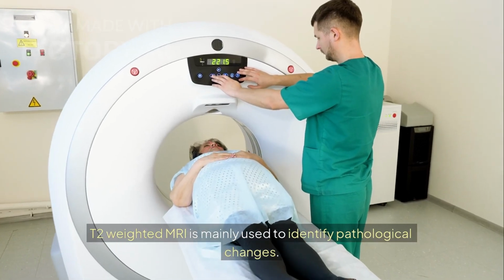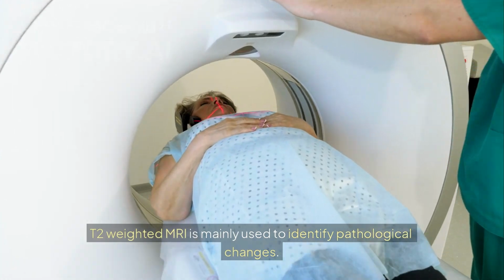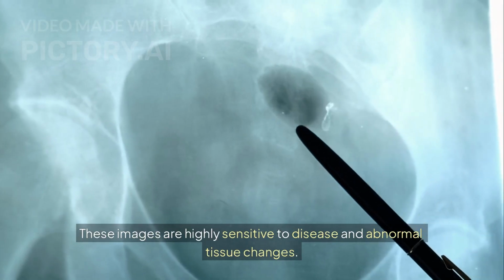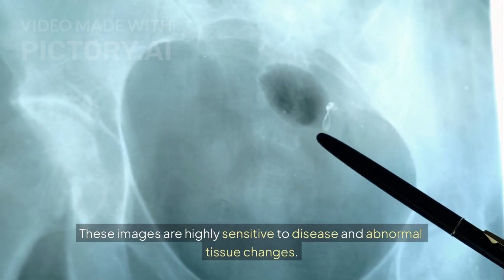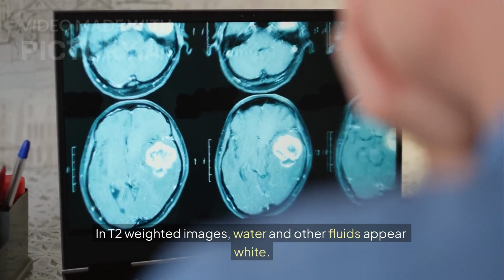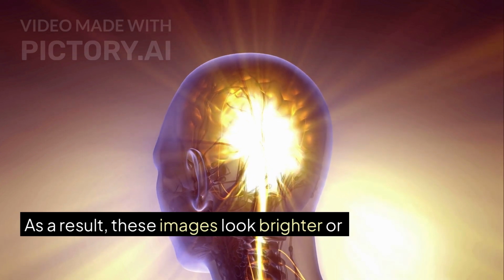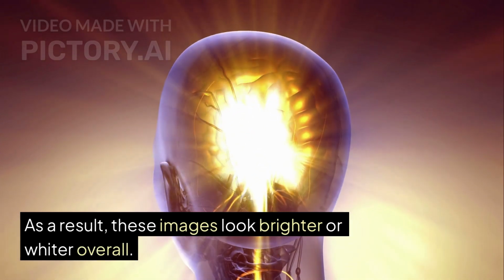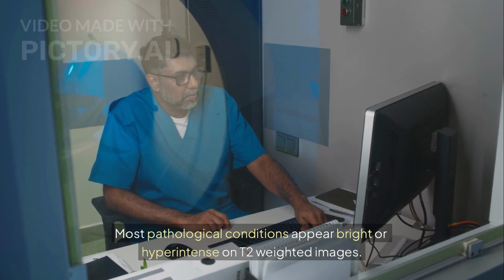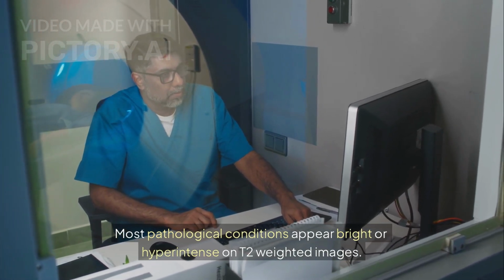T2 weighted MRI is mainly used to identify pathological changes. These images are highly sensitive to disease and abnormal tissue changes. In T2 weighted images, water and other fluids appear white. As a result, these images look brighter or whiter overall. Most pathological conditions appear bright or hyperintense on T2 weighted images.